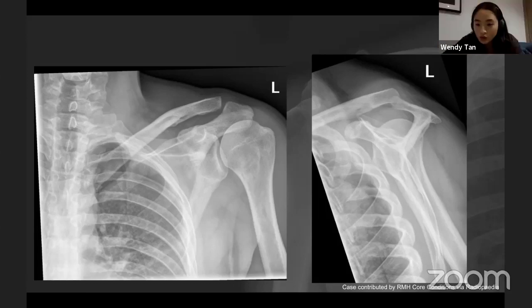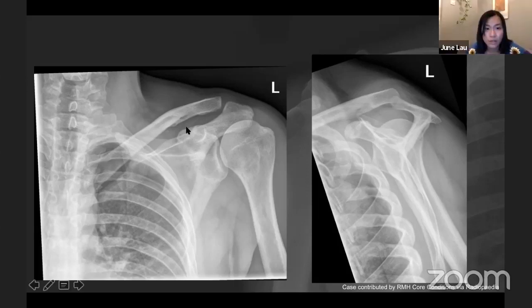Someone also said clavicular fracture. Unfortunately that is the irregular surface of the underneath of the clavicle. I know that's not very helpful, but that's not fractured. You're getting warmer though. You were looking here, then you're looking here. Keep going.